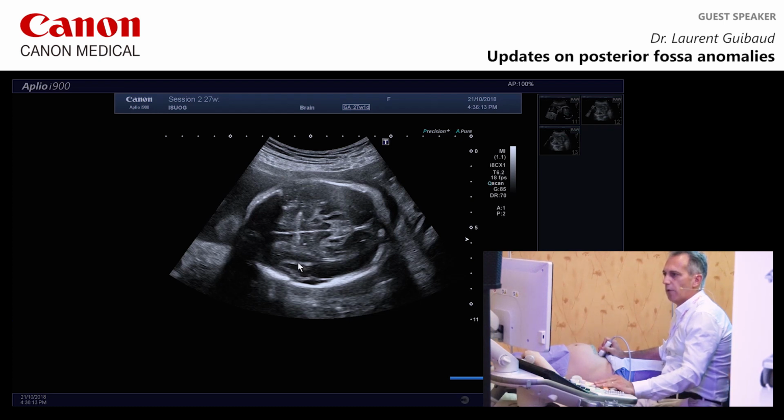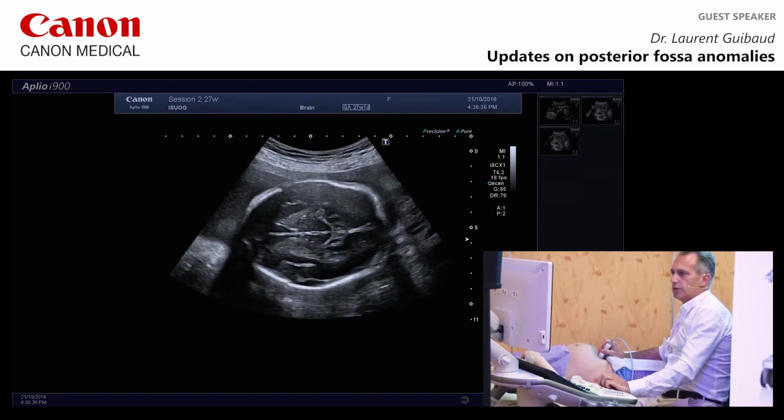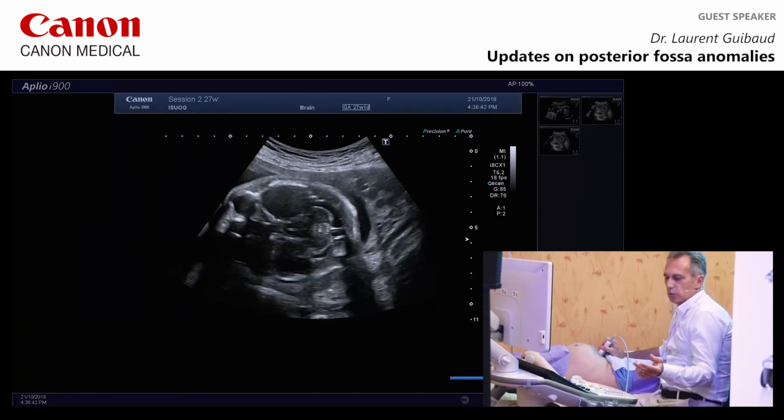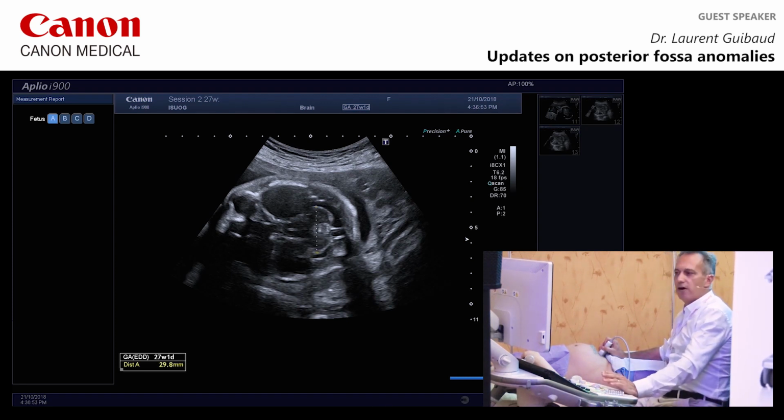The insula will be covered by the temporal lobe at 32 here, 28 here, 26 here, and we are between 26 and 28 here, and we are around 27. In most patients, we have here the superior temporal sulcus, and this patient is close to 27. So if it's 27, you can expect what the TCD is. At 27, it should be around 30. So if you put it here, you see, it's not far from 30.